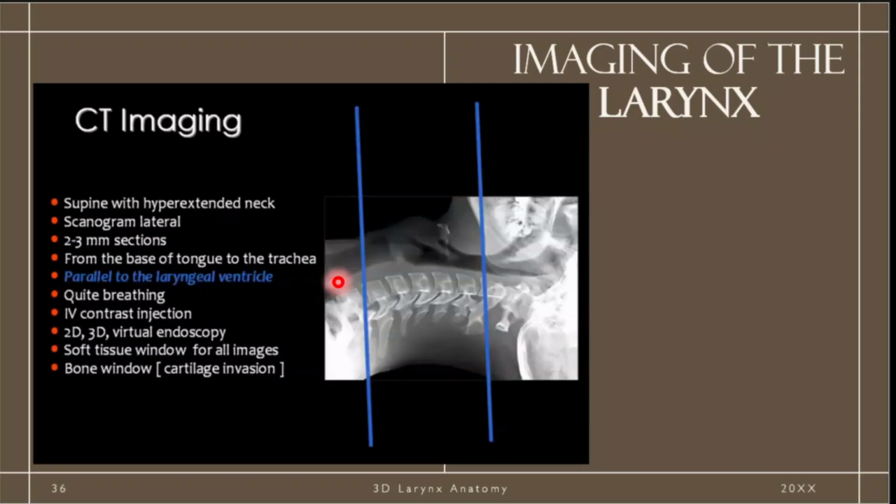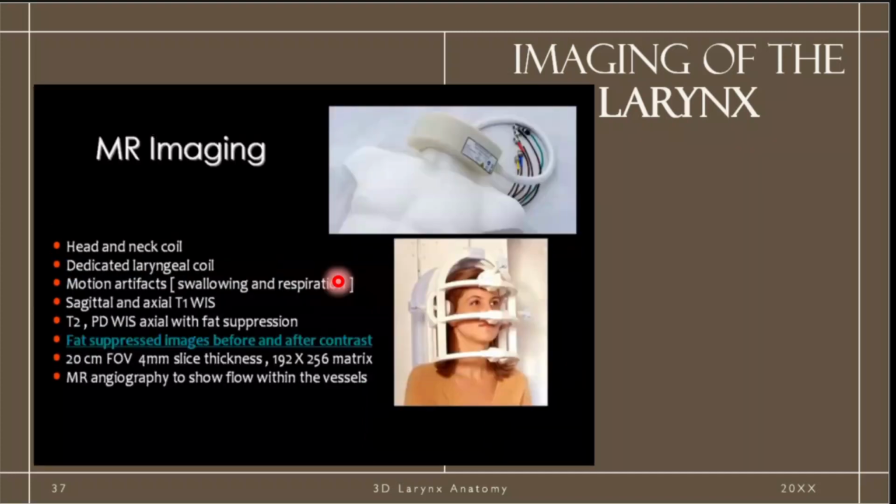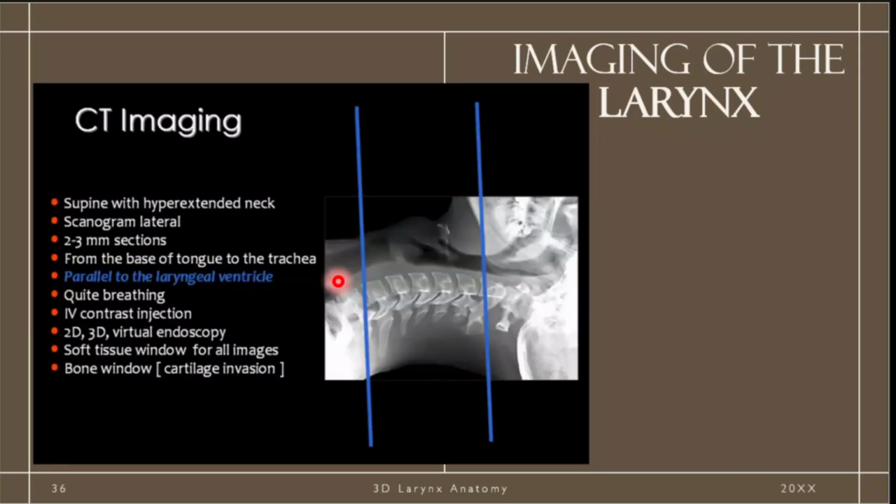Is it CT or MRI? Well, usually the CT is more than enough. Post-contrast CT of the larynx can depict a very beautiful image of the larynx with any abnormality, and it has a very important value in reviewing any abnormality or tumor in the larynx. We only do MRI in the controversial cases where the CT can't give us all the data that we need, and the CT also has the advantage of a much shorter time than MRI.